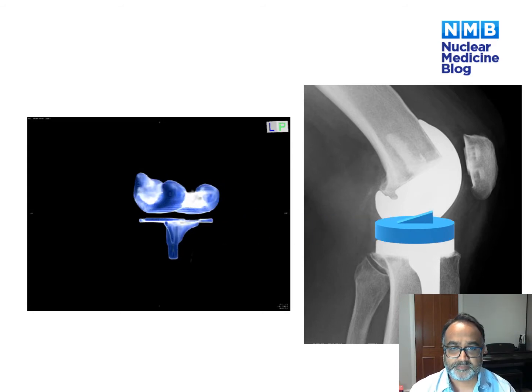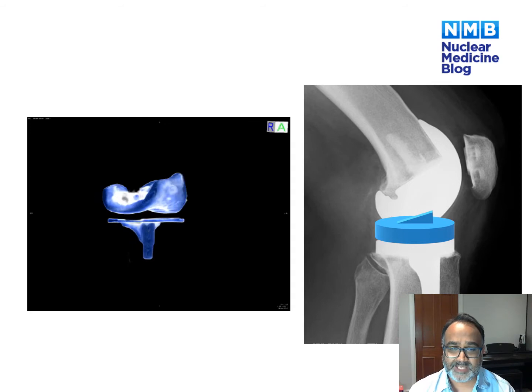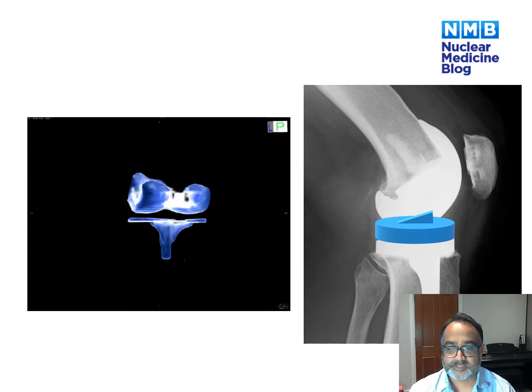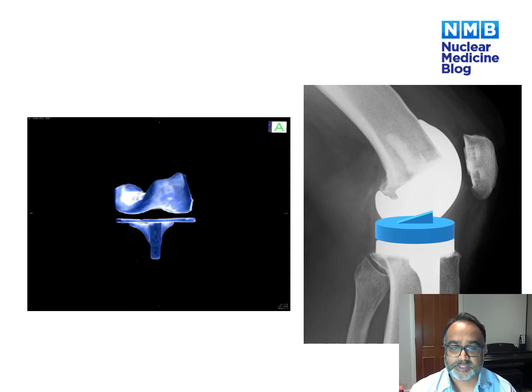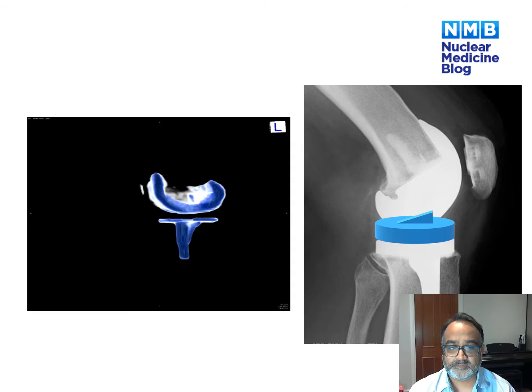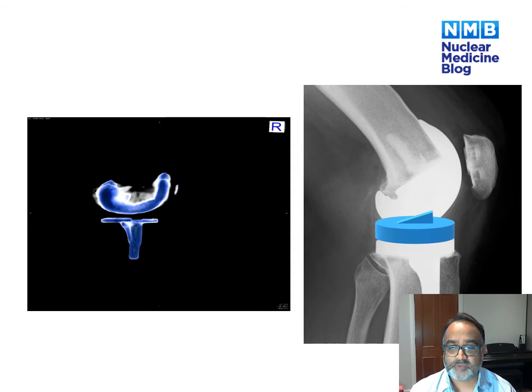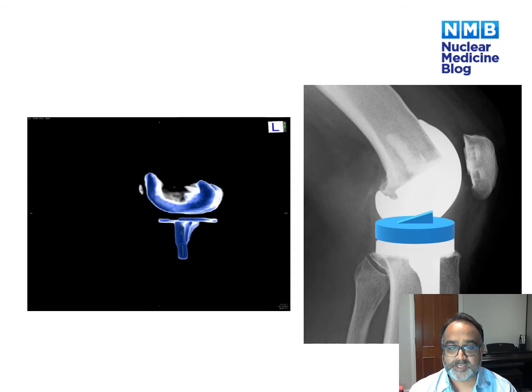Don't forget, between the femoral and the tibial component, there is usually a plastic spacer which acts as the meniscus does in the normal knee. Sometimes this has a keel in patients who have a cruciate replacing knee replacement and acts as a stabilizing function for the knee.